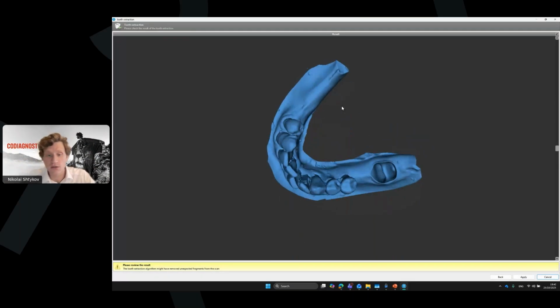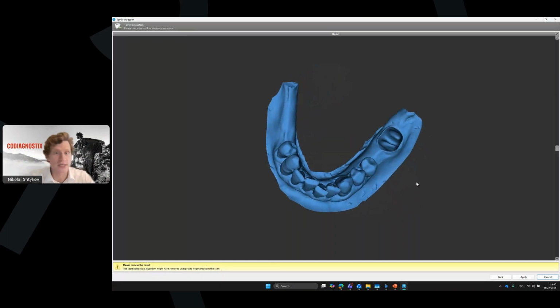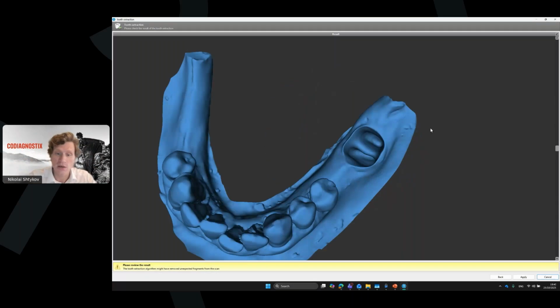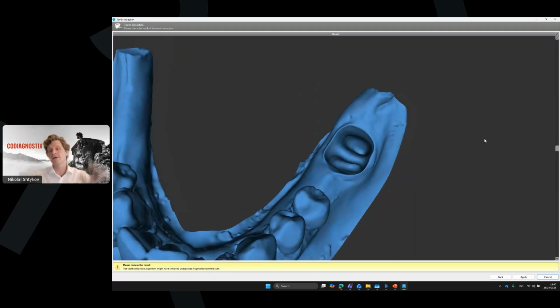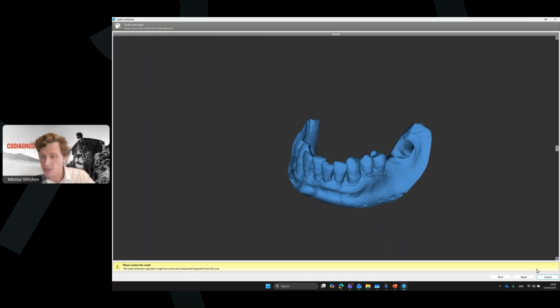You see that it just takes a few seconds. This is not a recording, this is a real-time simulation, and you can see that when we plan our implant, we can really understand where we will have the extracted tooth and where we will have bone. Yeah. But for this case, let's maybe extract in a different way.